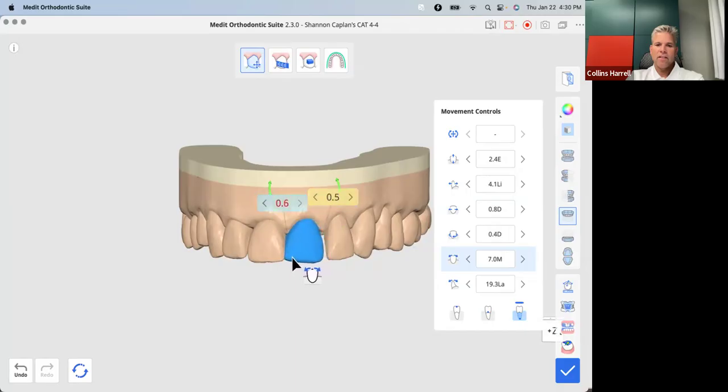That looks different, doesn't it? And watch how different it looks when I switch it to, I kind of think of it as like I'm locking the incisal edge, and watch this one. So when I'm changing angulation, I kind of like locking the crown and moving the root.